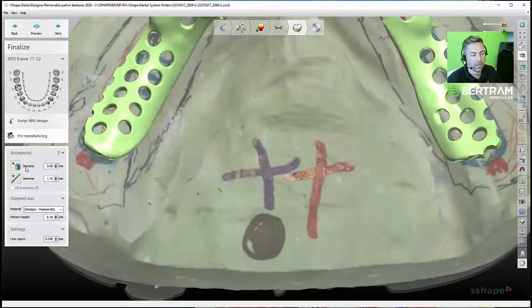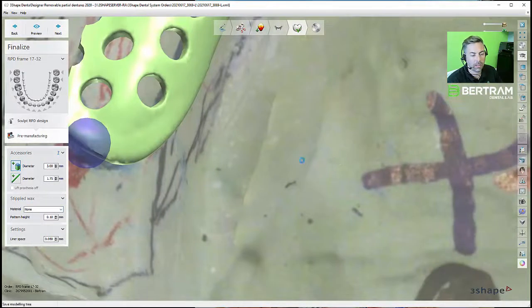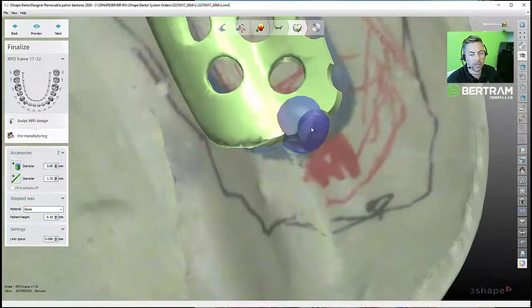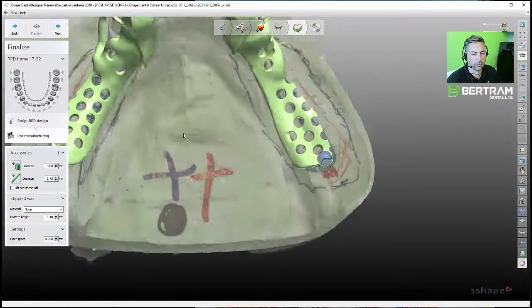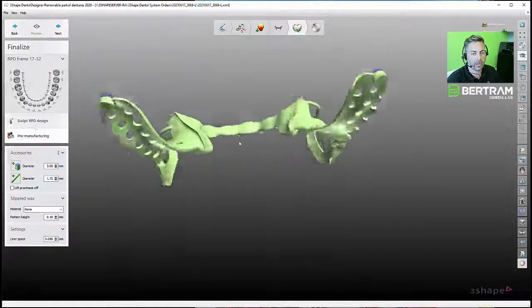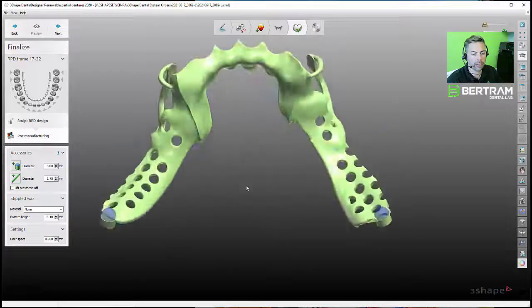The only thing we should have to do still is our default 3mm tissue stop. We know this is going to be no stipple. Our line spacer is our usual 0.050. All right, let's preview that. There we go. I hit S as in Sam on my shortcut. And that looks good.